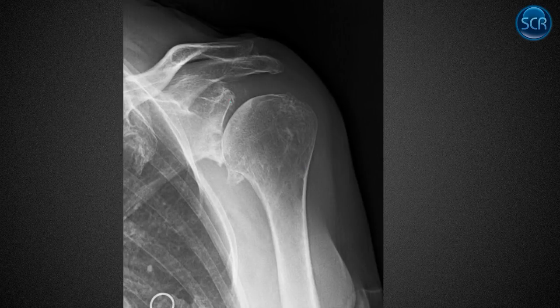What are we seeing here? Not uniform loss of joint space, non-uniform loss in this case, right? It's narrow down here, but it's wider up here. So this is typical degenerative disease. We've got some sclerosis, subchondral cyst formation. We've got a big old osteophyte hanging off the inferior surface of the humeral head here. This is classic osteoarthritis in the shoulder.